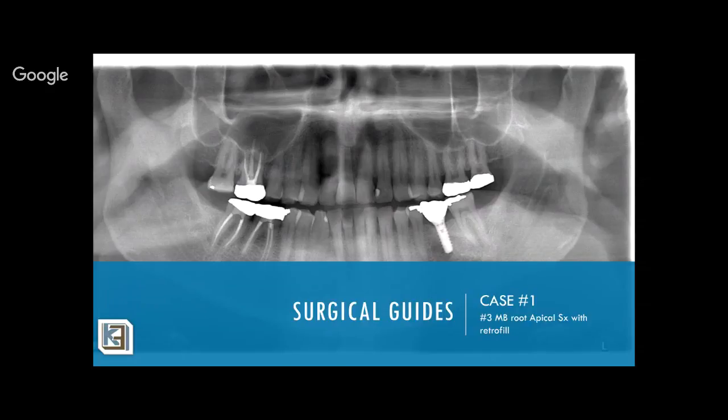So everything is just like you're planning for an implant. You need the CT scan, you need an intraoral scan or a model scan or a model DICOM import into the software. You need to merge those two to create as accurate as possible, because you create your Endo Access Guide or your surgical guide on the STL file, not the DICOM files.